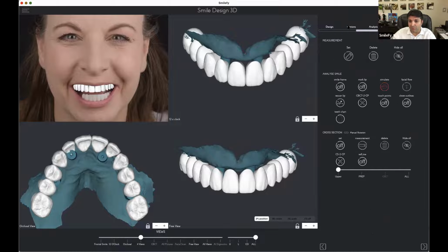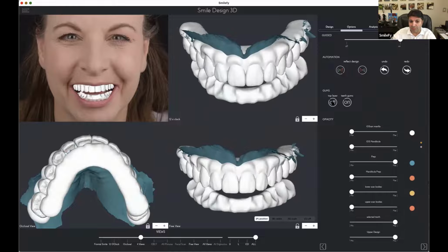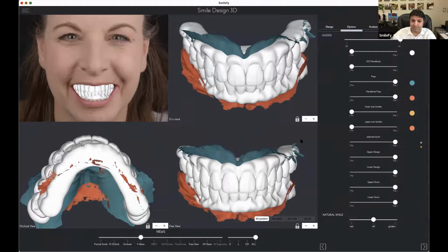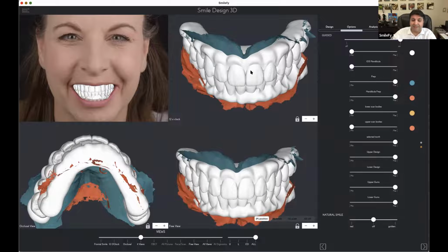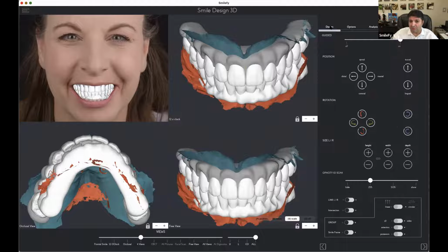And now we go to the next step, where we put the prosthesis, the gums. Now, let me show you how we do all this stuff. So for now, we generate gums, right? We generate the gums here. We're gonna have better calculations.